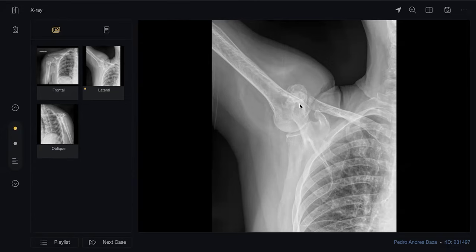It's overlapping the bone. And it points away from the joint. Yes, it's away from the joint. So could it be osteochondroma? Yes. Okay, one thing is done. This is osteochondroma, right?